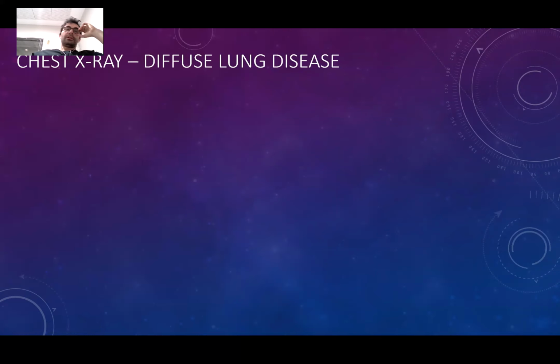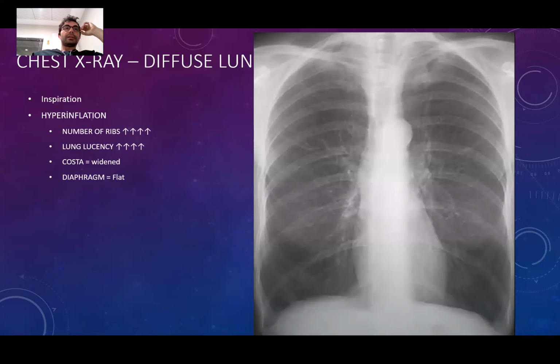I want to speak about diffuse lung disease a little bit. This is a case of hyperinflation, people. If I count the ribs, it's first, second, 3, 4, 5, 6, 7. I'm counting 7 ribs on the posterior.